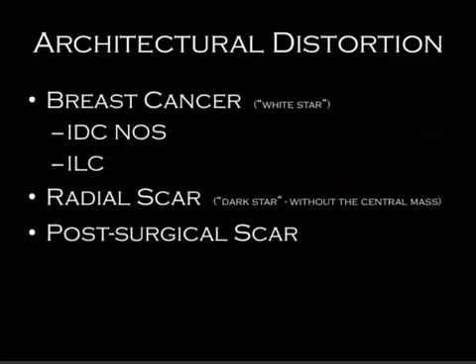So there's a differential: IDC, ILC, radial scar, and surgical scar. This is a classic differential for architectural distortion. Basically, if they haven't had surgery, it's something bad.